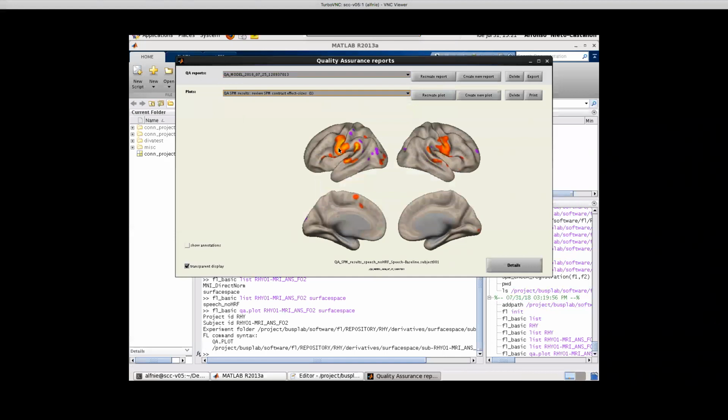One thing that you were mentioning is whether it's possible to plot this on the actual surface of that individual subject instead of the FS average surface. That's what you were asking before. Yes, I'll add it. Currently, we don't have a simple syntax to do that. It's possible, but it requires a relatively complex syntax. So I'll add the ability to do that because it might be useful for these quality assurance plots to be generated on the actual subject space. I would call it imperative to be able to see this on the actual individual surfaces.